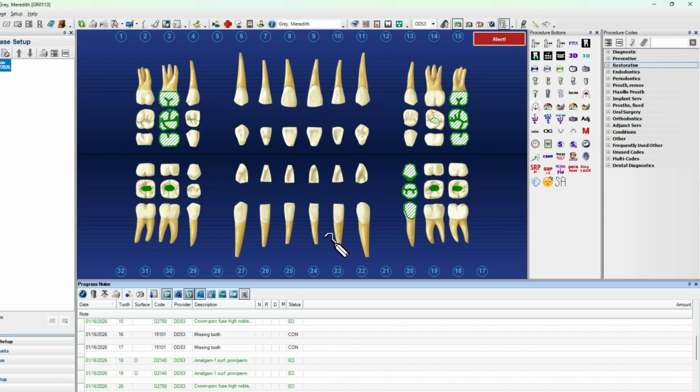Everything's in here now, but a thing that I highly recommend is taking intraoral photos. I am a big believer in intraoral photos, and not just for treatment, but for getting a baseline of what your patient looks like. So new patient comes in, they have these existing restorations. I really believe taking photos of all of them, really of all of the teeth at their new patient appointment is so important. There have been numerous times where I've needed to go back and reference what a tooth looked like when they first started.